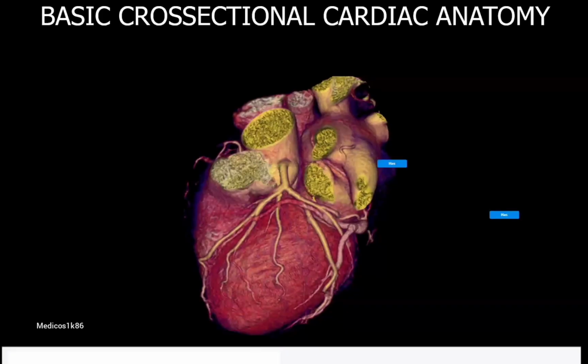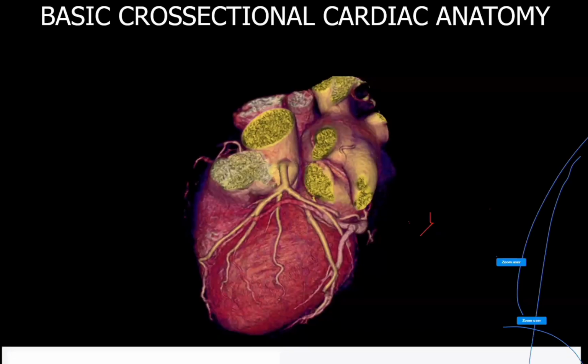In this case, what we are doing is using some software and using the high rotation speed, the high temporal resolution, to get images without motion from the heart. Also, the heart vessel, as you know, when we are trying to get good image quality from a 1 millimeter diameter thickness in the vessel, we should provide the best conditions and then go to scan. But the first thing, before the acquisition, we should know some basic anatomy information about the heart. Okay, let me start.